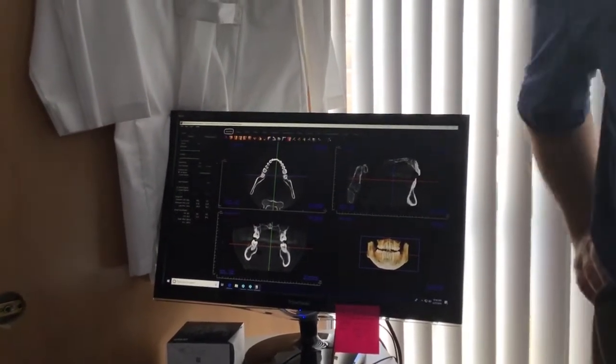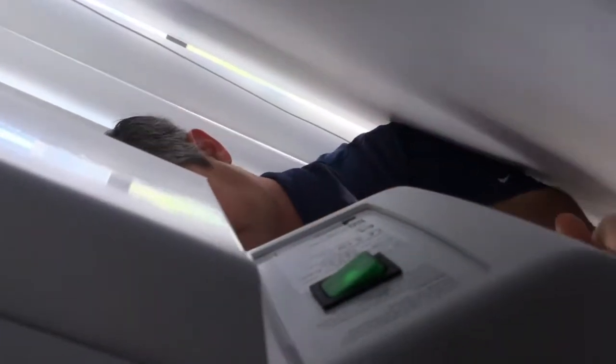At the end of the night, are you guys done with this for the day, or do you want to play with it some? At the end of the night, flip the power switch off, and I recommend unplugging it. It's just a rocker switch. Here, I'll lower it down so you can see a little better. There it is. It's just a flip switch.